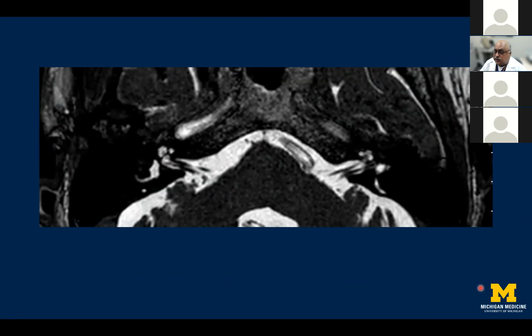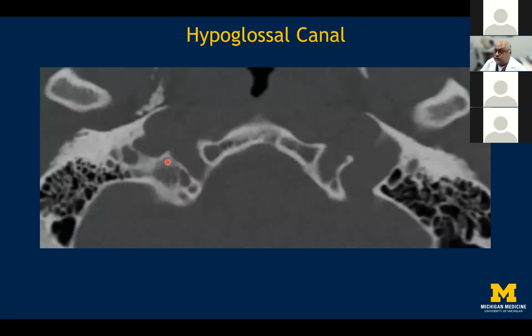Next is the all-important internal auditory canal, where we can see the 7th and 8th cranial nerves. Everyone can recognize it. But just to make you aware, the cochlear canal has to be identified in every patient, because that is the entry of the cochlear nerve into the cochlea. Also identify, on high resolution CT scans, the superior and inferior vestibular canals, which house the two divisions of the vestibular nerve.